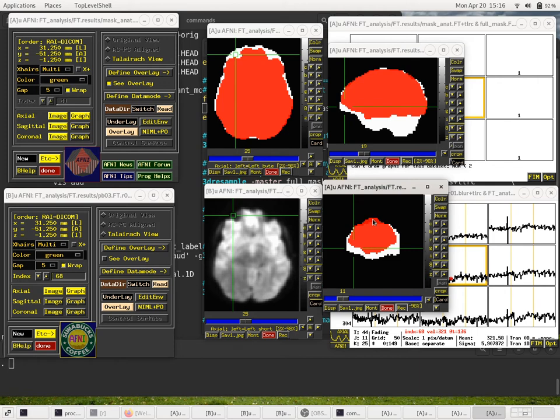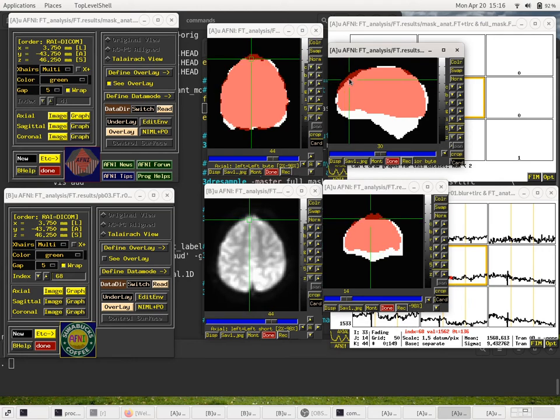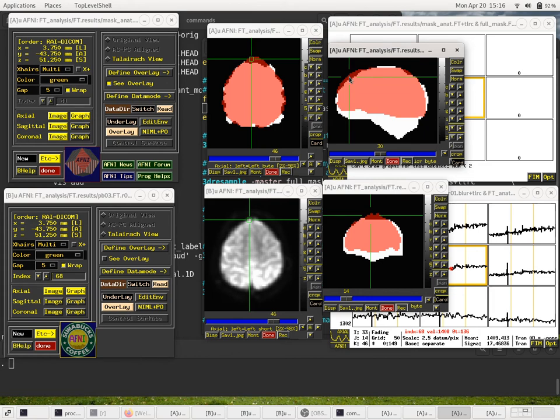So where does that happen? If we go over there and take a look at it, you can see that's probably a distortion. So you can see this part here. I don't know if you can tell that well in the video. You see it kind of sticks out in front right here. So do you want to include that or not? So that's a result of this distortion probably, and I'm not sure whether you want to count this as part of your mask.